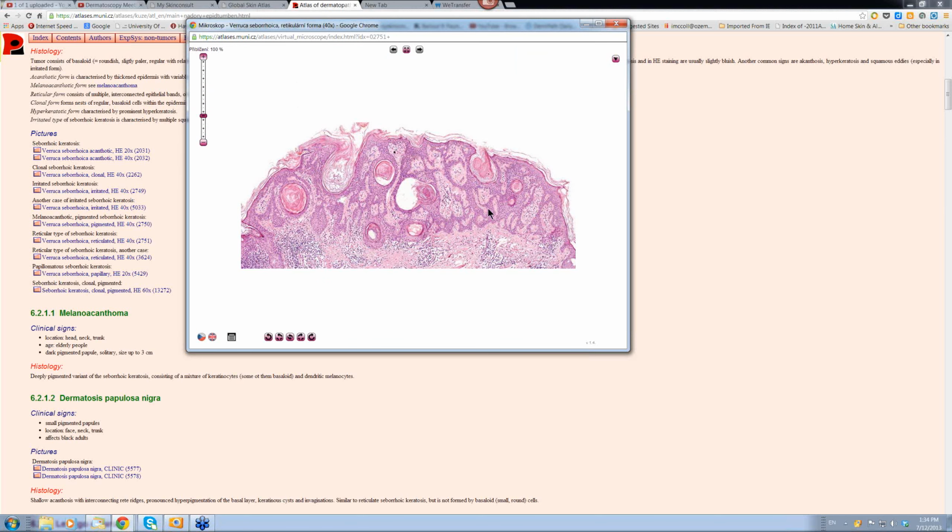There's the reticulated pattern here that they talk about, all these strands of cells. And again, you've got little cysts, keratin-lined cysts, squamous-lined keratinous cysts here, some opening onto the surface. These would be crypts, these would be milia. This is a bit inflamed as well.